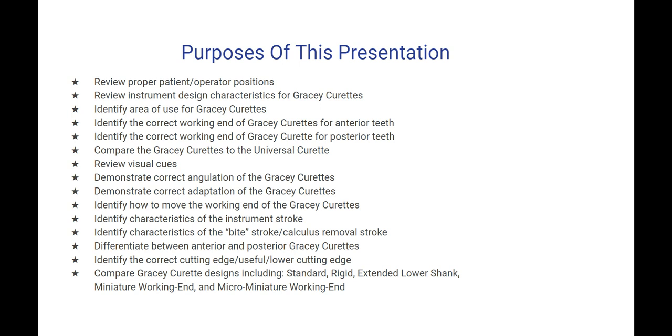Differentiate between anterior and posterior Gracey Curettes. Identify the correct cutting edge, useful or lower cutting edge. Compare Gracey Curette designs, including standard, rigid, extended lower shank, miniature working end, micro-miniature working end.